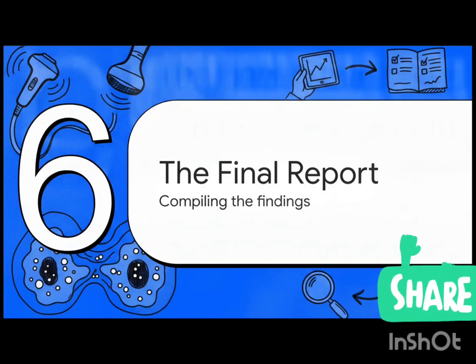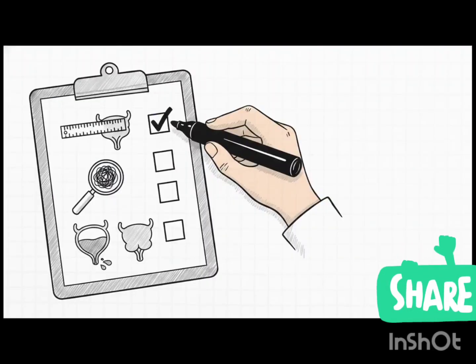Okay, so once the sonographer has mapped the dimensions, noted the echo texture, and hunted down any bright calcifications or dark anechoic cysts, the scanning part is over. Now comes Part 6, our final step, synthesizing the final report. All of those visual measurements and sonographic anomalies we just talked about are methodically compiled into a highly actionable medical document. The final professional report is essentially a master checklist.